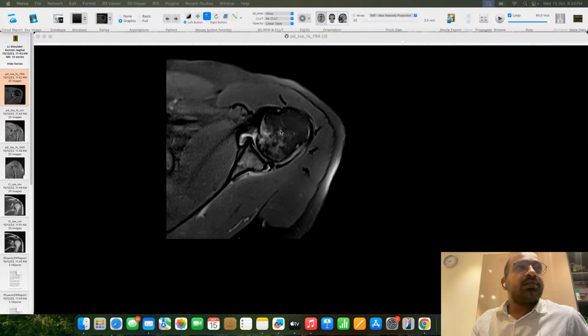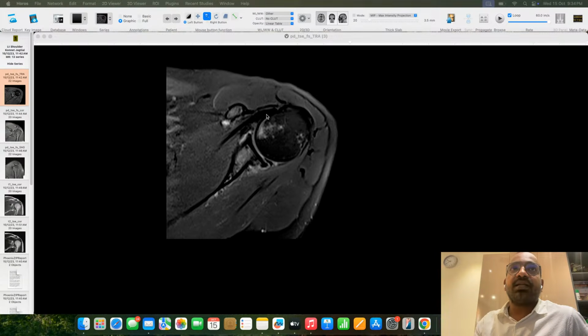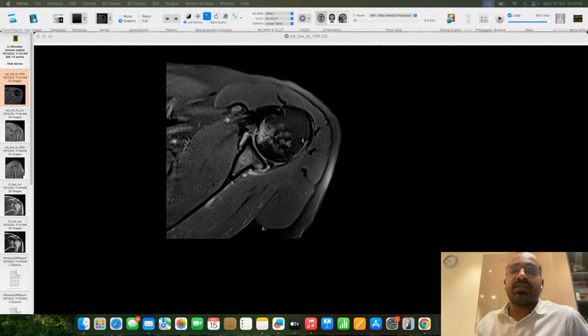This is the defect, right? So in the McLaughlin procedure, this is the subscapularis tendon, right? They position the subscapularis tendon into the bony defect. So that will prevent and keep the humerus within the cup, that is within the glenoid.